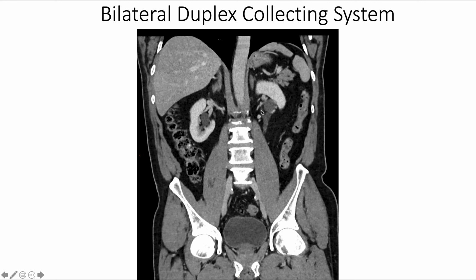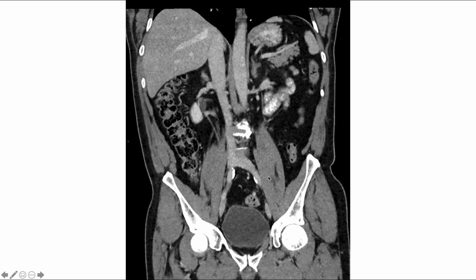The left kidney is very clearly appreciated in this coronal CT, where we can visualize the Y-shaped ureter as it descends retroperitoneally, anterior to the psoas major muscle and posterior to the gonadal vessels. So moving anteriorly, here, although not as clear, we can visualize this Y-shaped structure that again represents the bifid or Y-shaped ureter. On the right-hand side of this patient, the bifurcation occurs more inferiorly than on the left-hand side.